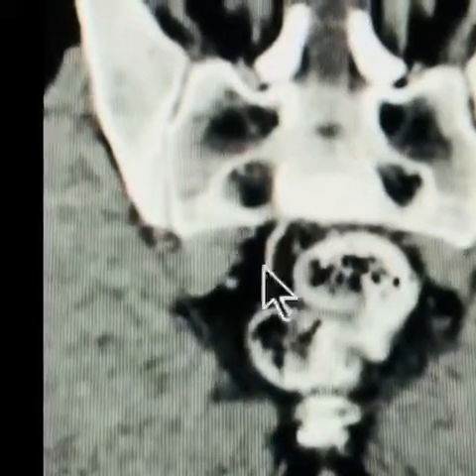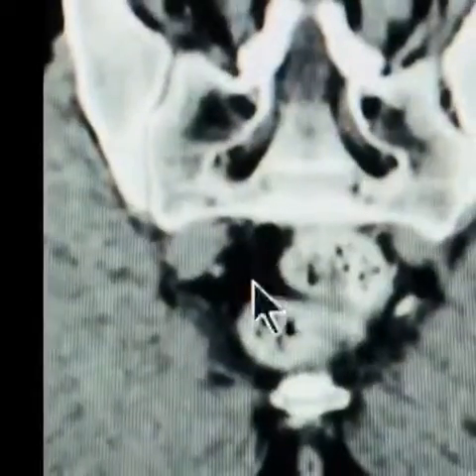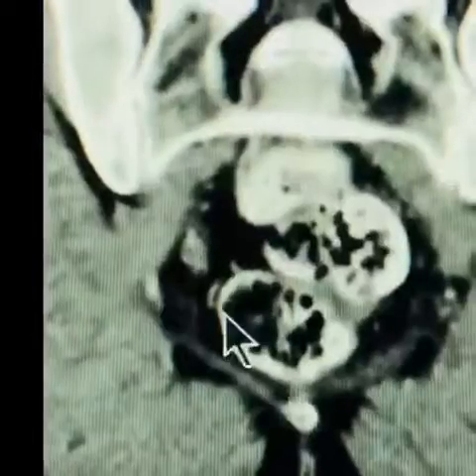Now as we go farther inside, we will see the rectum. We will also see an artery here called the middle rectal artery. It's very subtle, but see this long stringy thing? That's an artery, and as we scroll inward, we will see how it kind of goes down and connects right into there.